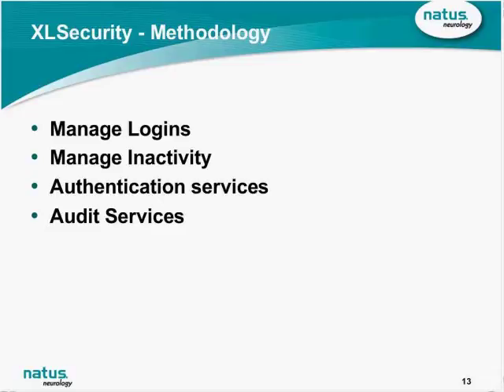We provide authentication services. By that I mean we can actually develop permissions and provide specific users with them. We can say, let's allow these types of users, say technologists. If we create a group called technologists, any technologist should be able to acquire or record a study, open a study in review.